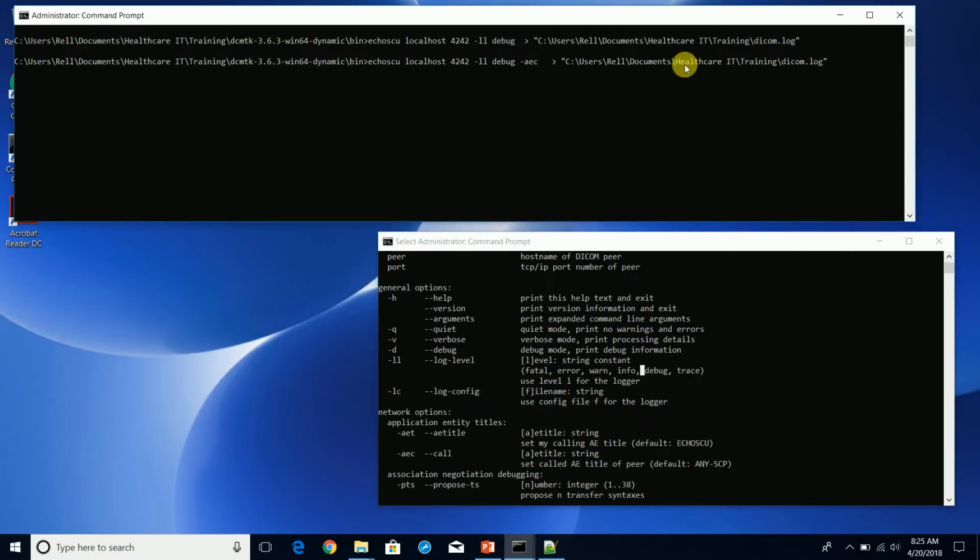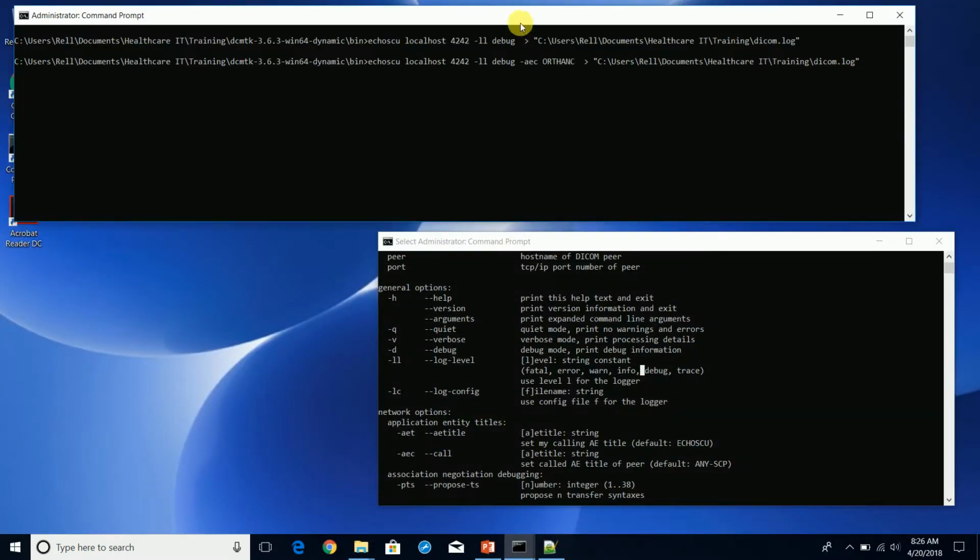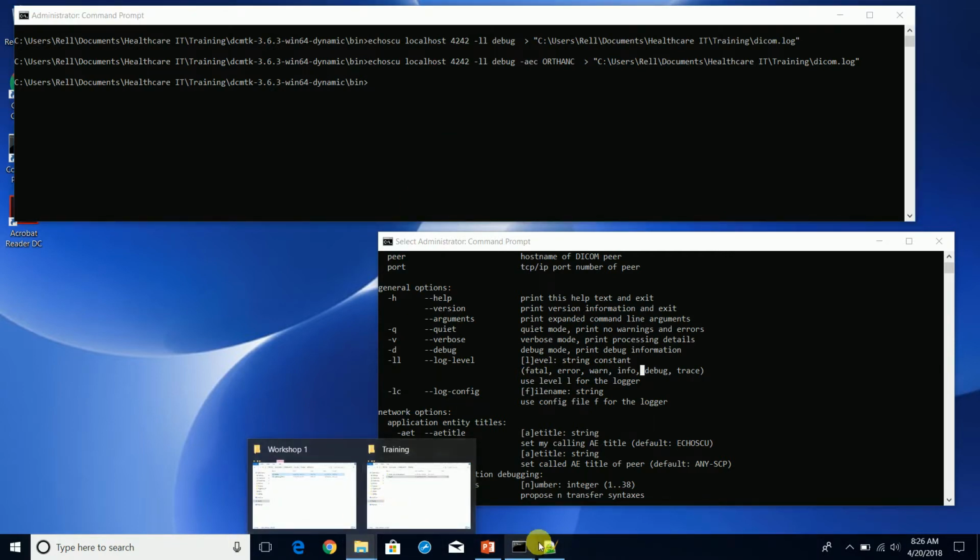All right, so the AE title is going to be, let's just say we're going to do a fake AE title. Or let's just do the real AE title. All right. Let's take a look at our log.